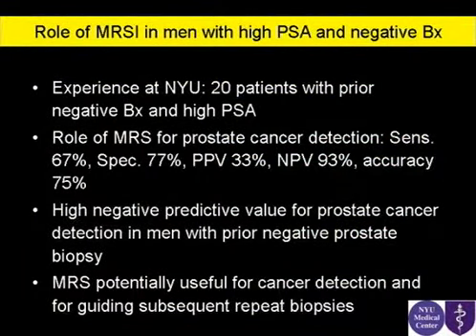I told you at the end that this indication is appearing more and more now. There are a couple of papers recently, and it's been our experience also, to have these men who have high PSA levels and multiple negative biopsies. Our experience with 20 patients showed that spectroscopy alone had a very high negative predictive value. In other terms, if you see nothing on spectroscopy, you can really reassure the patient and say there's probably nothing. The PSA elevation is probably due to other etiologies, such as size of the prostate or BPH, and the accuracy was about 75%. You see here that the sensitivity was 67%.